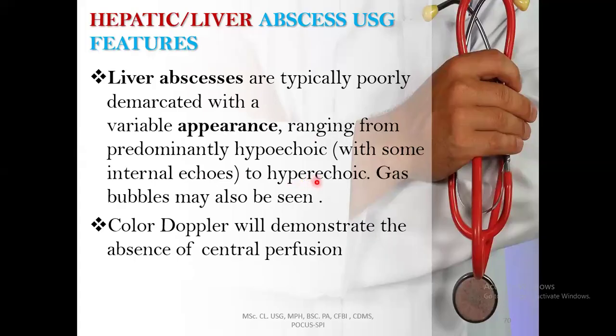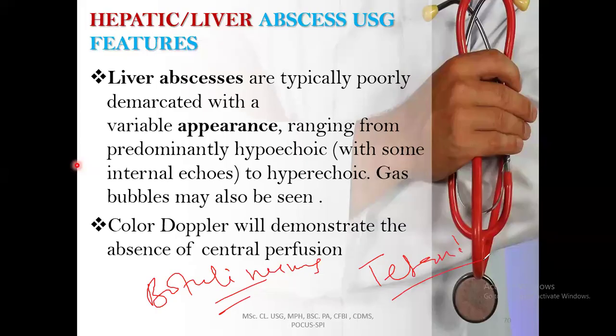To hyperechoic, gas bubbles may be seen, especially if gas-producing bacteria like the Clostridium species are there. There are some bacterial species, we call them Clostridium botulinum. Clostridium tetani is also one.